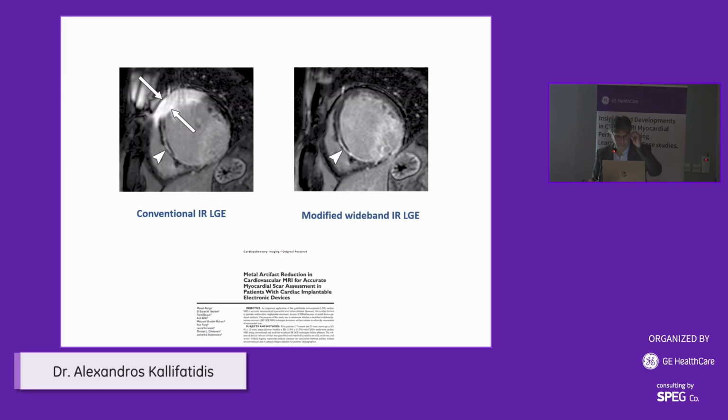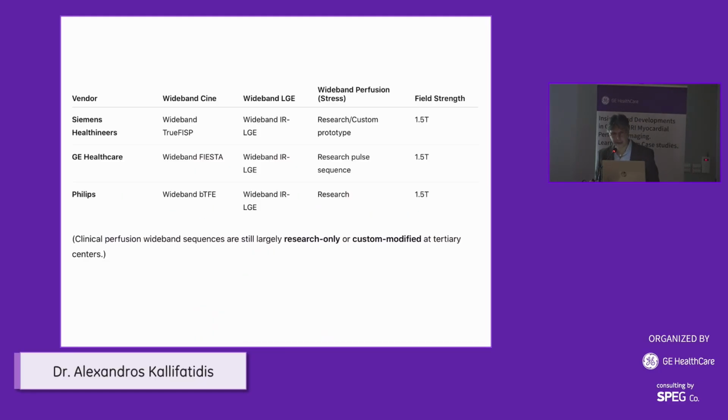Here is an example from the literature that shows the conventional inversion recovery LGE sequence and a modified wideband inversion recovery LGE sequence that is very helpful in order to exclude this artifact from our region of interest, and we can nicely see the fibrosis.